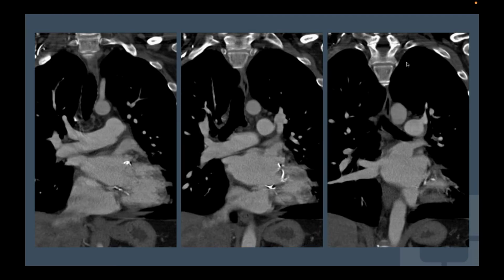All right, let's look at this. So 3 coronal reconstructions through the heart, moving from, on the left, the most anterior, moving towards the back. Anything there that catches your attention? And again, this is a PE study. This is a poor bolus timing for sure, but it's not gated, so that's why you have those slight slab artifacts on the heart.